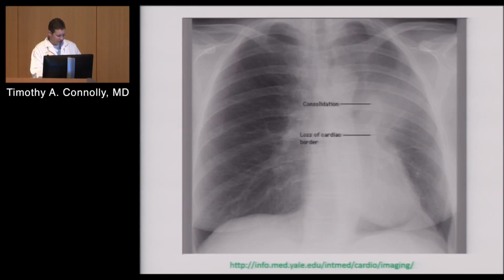So again, it just shows a degree of haziness, a degree of whiteout. There's no way you can look at this plain film and say there isn't a tumor there. You can't say that there isn't loculated pleural effusion. But the likelihood and the most consistent other findings, because you're not seeing other things on the film that would suggest alternate diagnoses, is probably atelectasis, whether it's a mucus plug, aspirated foreign body, or tumor. Again, anything that causes a blockage of the airway, occludes an airway, everything beyond it is going to collapse. So, simple physiology on this.